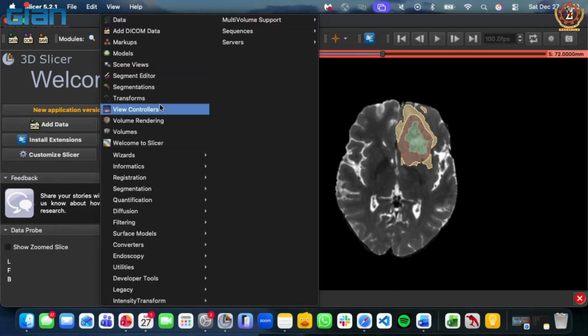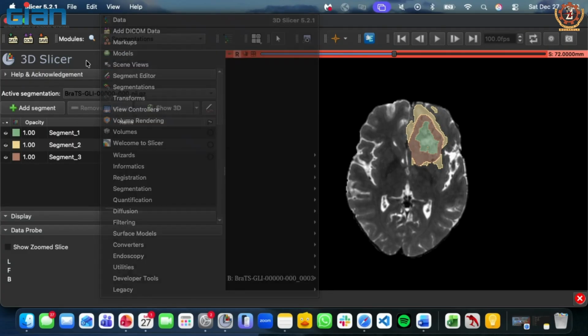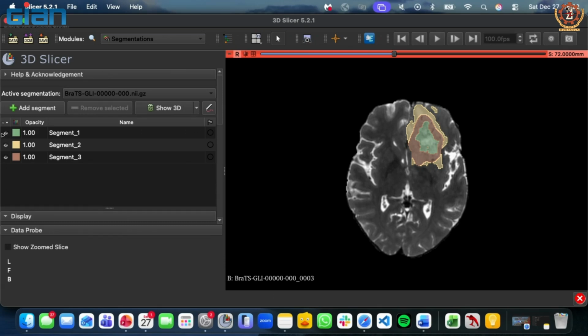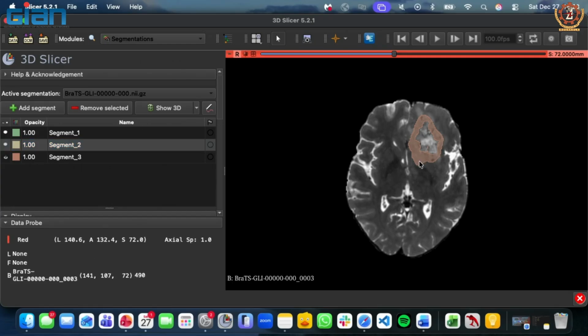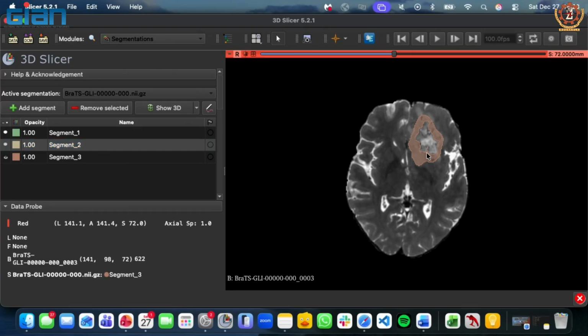And these are the different compartments of the tumor. So if you click this drop down icon and then click segmentation, you will see these three labels here. If you want to just look at the enhancing tumor, which ideally a neuroradiologist would like to see, you can just click the eye next to the segmentation icon, and if you close those eyes, those labels will be gone, and you can just see the enhancing part.